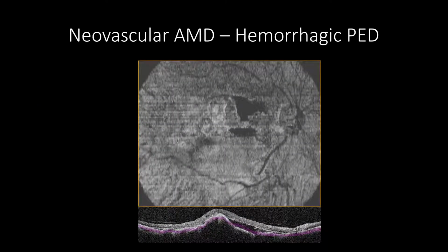The choroidal slab may show hyperreflectivity due to blood and depend on segmentation level. In the B-scan OCT cross-section, the hemorrhagic PED will show increased reflectivity under the RPE due to blood accumulation. However, in cases of a high level of subretinal fluids, it can cause segmentation artifact producing hyporeflective patches at the choroidal slab level.